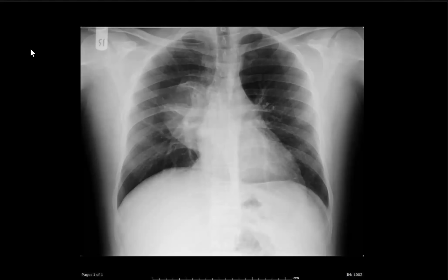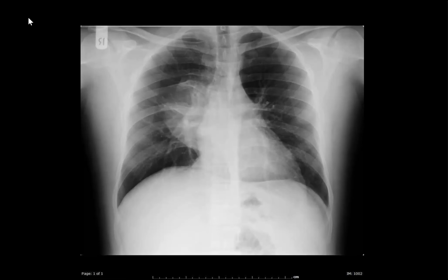So it is either anterior or posterior mediastinal. Keeping in view that I can see the cardiac silhouette, it is likely a posterior mediastinal mass lesion. The differentials could include neurogenic tumor or neuroenteric cyst. I would correlate my findings with the history of the patient, compare with any previous CT or X-ray radiograph available, and advise a cross-sectional study for further workup.